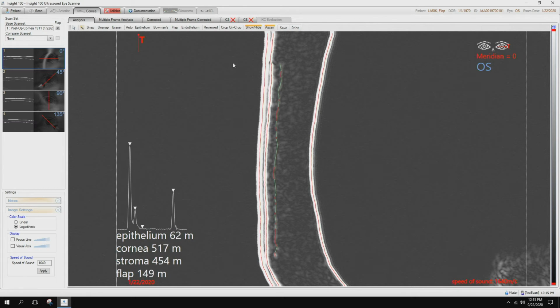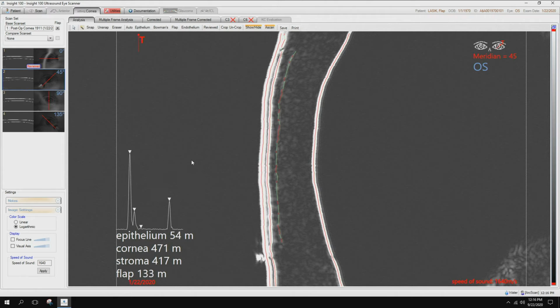In order to retrieve the existing epithelium maps, or the keratoconus report that's built into our system, the operators need to look at each of the individual scans that were taken and verify that our pickups were accurate. In this case, we can see that all of them picked up just perfectly. I simply click Reviewed, click to the next image. Same thing, we're taking a look through here to make sure that they've all been caught, they're looking good, hit Reviewed. Next image.